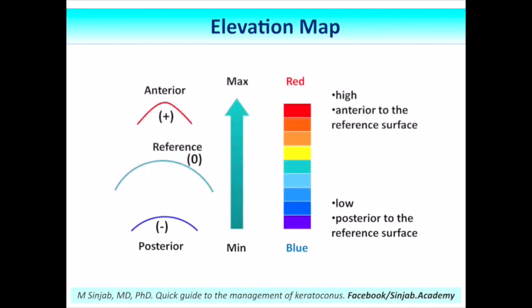In addition, this information will be color coded. So the higher the level, the hotter the color will be, and vice versa.